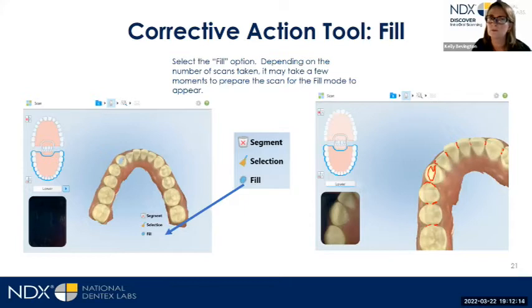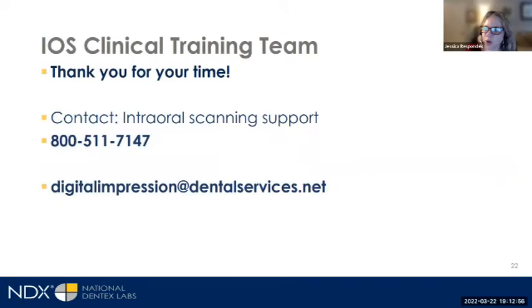That includes the fill tool. The fill tool can be used at the end, currently, with the software program most offices have now. Align is in the process of pushing some new software. We are currently working with the previous software that allows you to utilize the fill tool at the conclusion of all your scans. That's going to be shifting so that you're able to use it in the middle of the scans, which is personally my preference. Next week, when I do my scanning section, we hope to have that software upgrade. It's coming out incrementally.